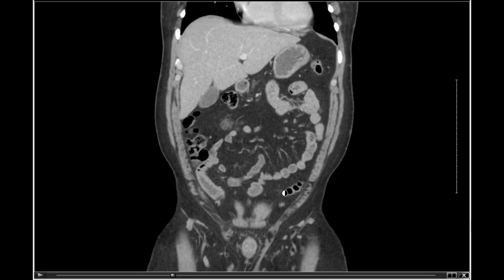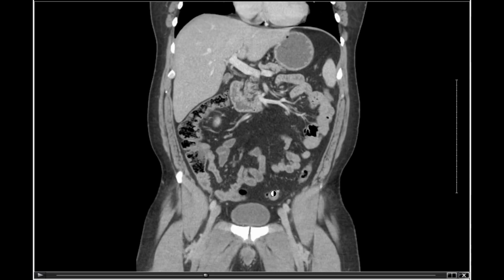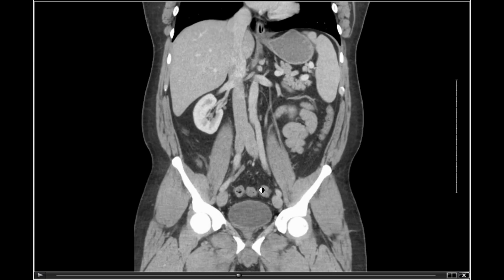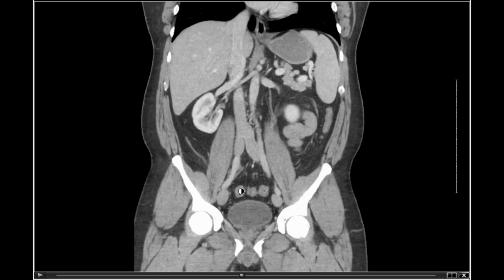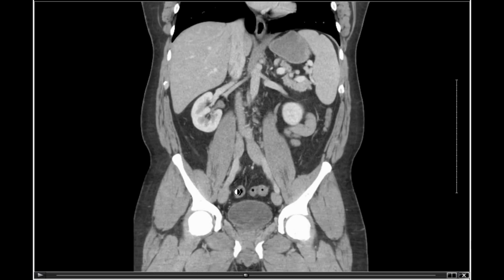Right there, we got some continuity, but then we got to roll back posteriorly to follow this part a little bit more. Part of reading these 2D images and constructing three-dimensionality of it is following it one direction and then following it at another. So here's the sigmoid colon, and it's about to take a turn south or inferiorly and become the rectum. Now right here we got my urinary bladder right there, moderately full, and iliac crest up here, iliac bone here, head of my femur here.